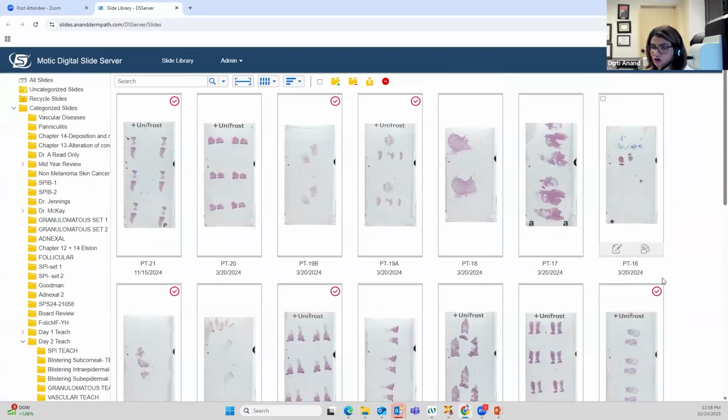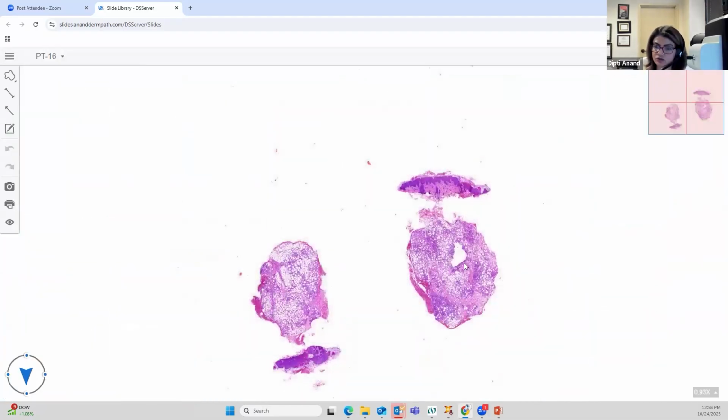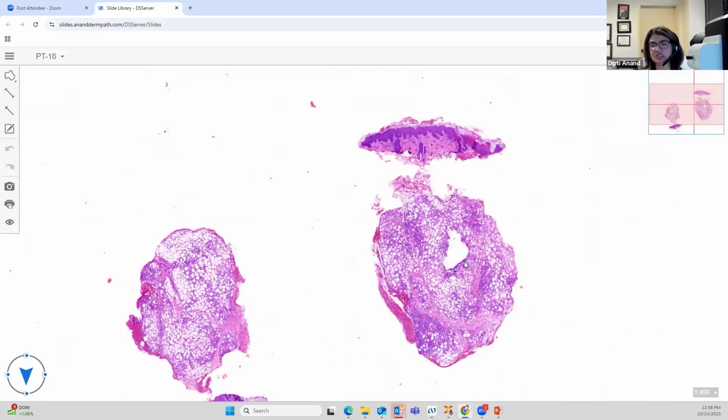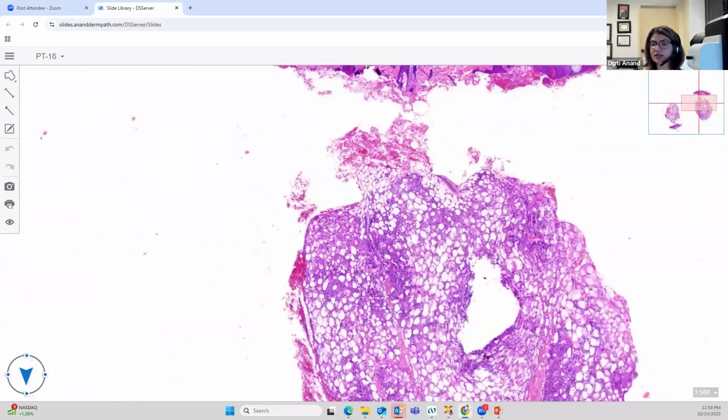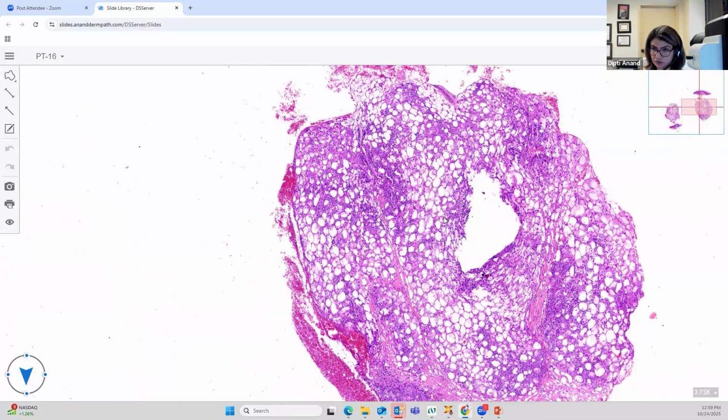Okay. The next pattern of fat necrosis is the subcutaneous fat necrosis of the newborn. This is pretty simple if you have seen it once. So subcutaneous fat necrosis of the newborn is a disease of the newborn. So they will have specimens which will make you instantly recognize that this is a young child or a newborn baby, because you can see that there is minimal dermis but a lot of fat, right? So their skin is very thin. The dermis is not yet developed. These patients are often preterm, premature, hypoxic infants, and they develop hypercalcemia and hypothermia.